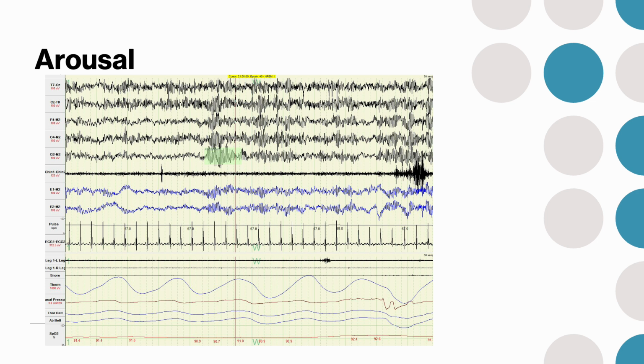Here's a record of an adult arousal. I picked this because of the huge alpha PDR that they have. We enter with non-REM, got some slow rolling eye movements. Then all of a sudden, they wake up. Eyes are closed, and huge alpha right there. This doesn't have to be all the craziness that the ISR likes you to have with arousals. A lot of arousals are really subtle, and you need to confirm the arousal with additional data. So that's why it's so important to have all the sensors working so that you can confirm or dispute your suspicions.